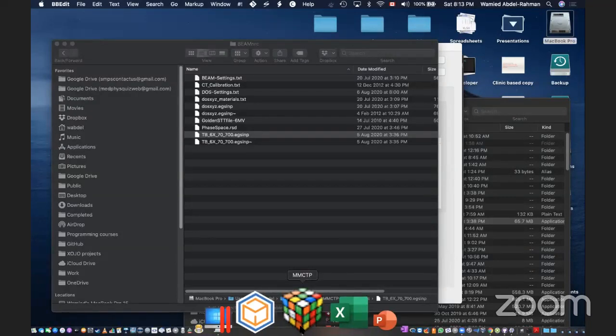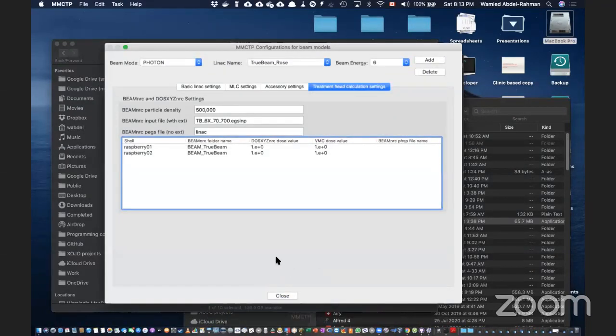Let's go back to an example of converting it using this. Yeah, I'm going to show you how, because it reads a DICOM file. So let's move forward.